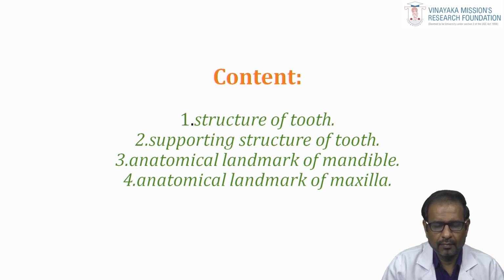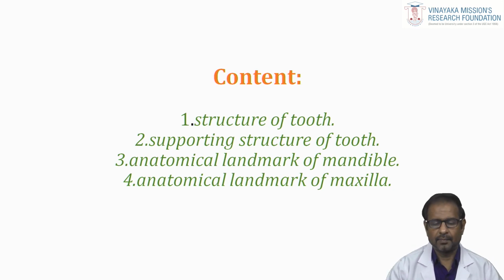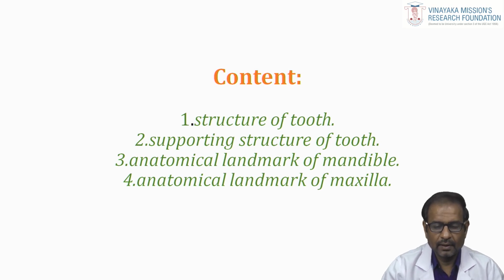Intraoral radiographic anatomy is a very important procedure to identify the lesions in intraoral radiographic films. Today's content is, first, structure of the tooth; second, supporting structure of the tooth; third, anatomical landmarks of the mandible; and fourth, anatomical landmarks of the maxilla. These are the four contents in my class.